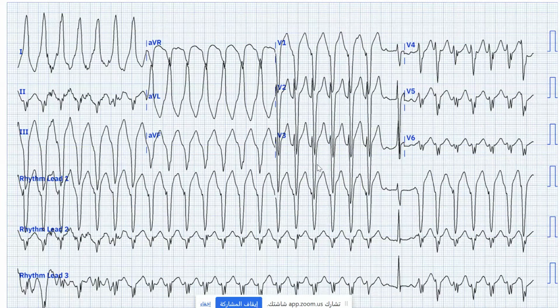So Namarek, let us take one by one. You mentioned likely ventricular tachycardia, and I agree with you 100%. Let us apply one of the criteria. First of all, look if there is any concordance or not. Look at V1, V2, V3, 4, 5, 6. Is there any positive or negative concordance here? Yeah, there is negative concordance here.